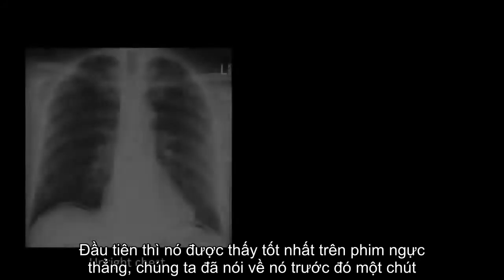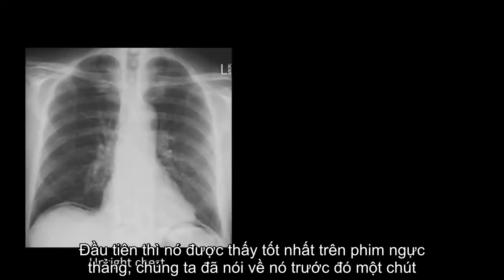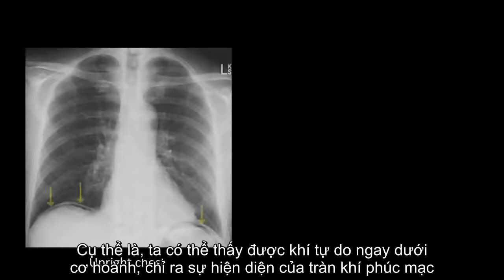I'm going to move from abnormalities of intraluminal gas to those of extraluminal gas, and there are two main ones to worry about. The first is best seen on an upright chest film, which we already discussed a little earlier. Specifically, we can see free air collecting immediately under the diaphragm, indicating the presence of pneumoperitoneum.